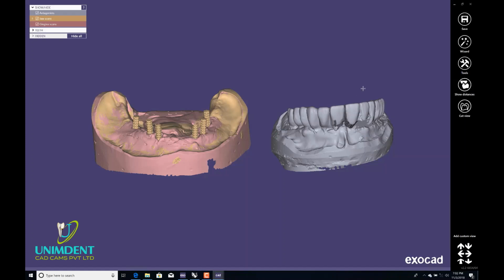So as you can see in this case, what I have to do is just change the orientation of this upper model, okay, related to our lower model. So in this case, first I gotta import an articulator, all right? So you gotta take these two models of your case, upper and lower, scan an articulator, and then save the STL file into the patient folder.